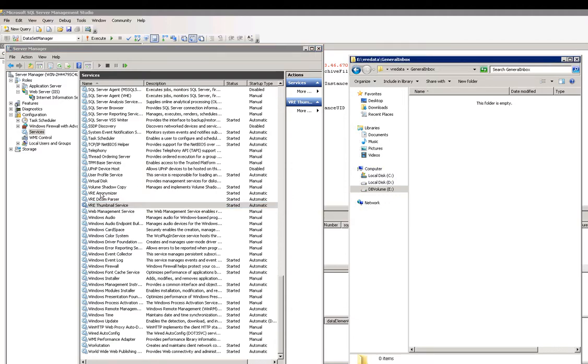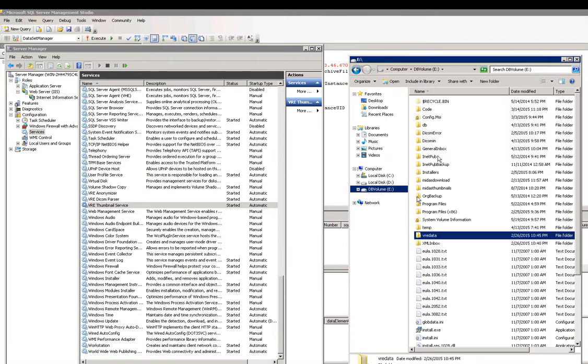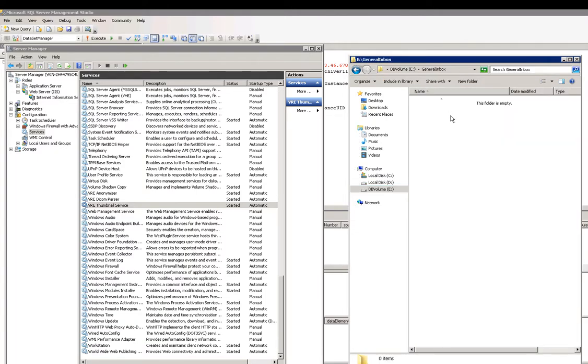The reason those are separate processes is that many customers often have data sets that have been anonymized in-house before they load them into the system, and they're comfortable with what those patient names and identifiers are. So there is a root level general inbox where data that's pre-anonymized can be placed, and then the system will consume it without modifying any of the values in the DICOM header.